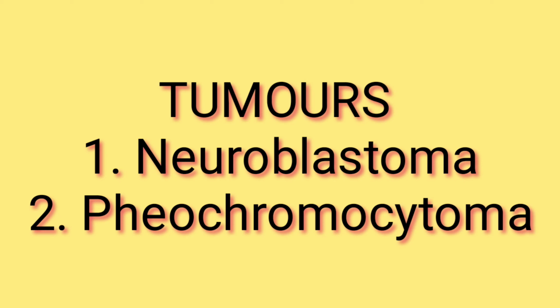For adrenal gland calcifications, two major tumors are responsible: neuroblastoma and pheochromocytoma. These two are the tumors which arise from the adrenal gland and give rise to calcification. When you observe calcification on the CT images within the adrenal gland, this could be neuroblastoma or this could be pheochromocytoma. You must compare it with the clinical and laboratory investigations as well.